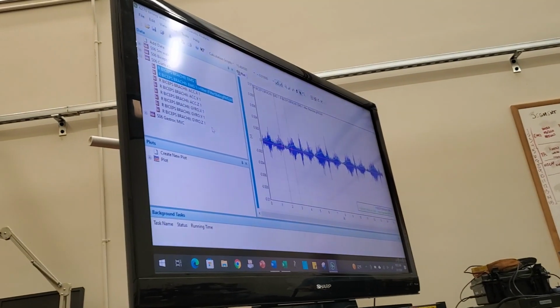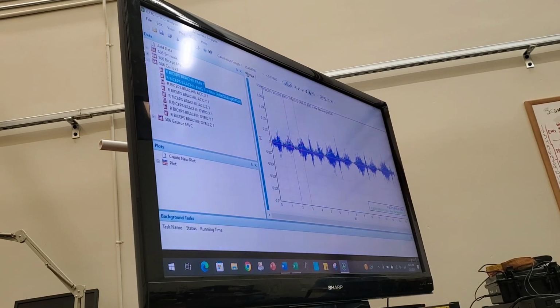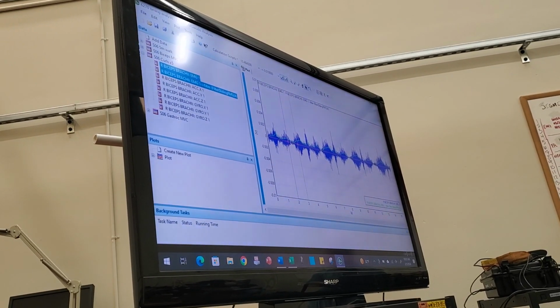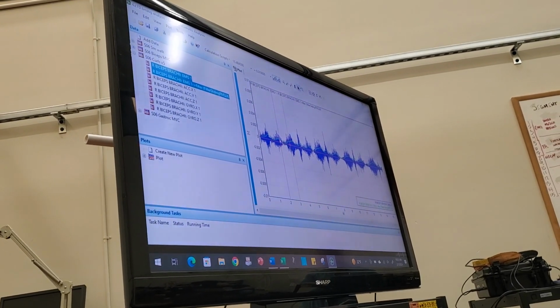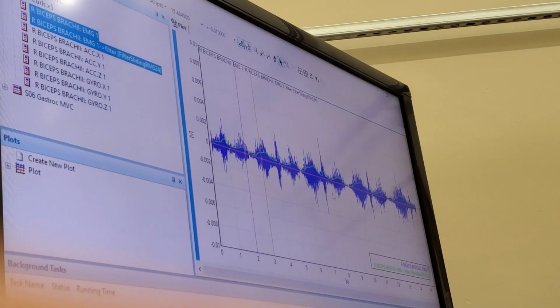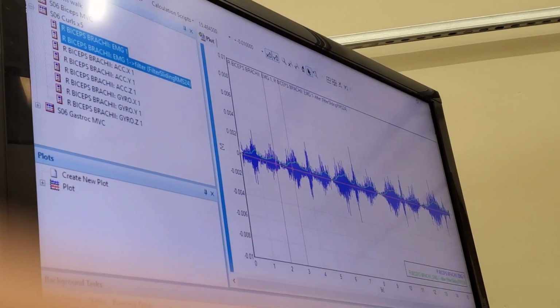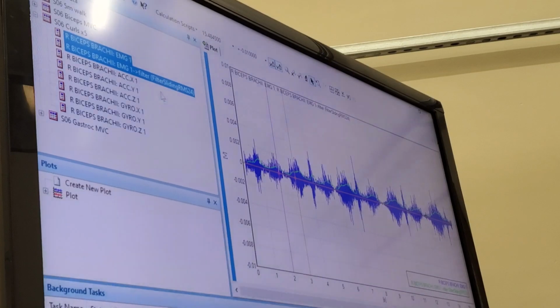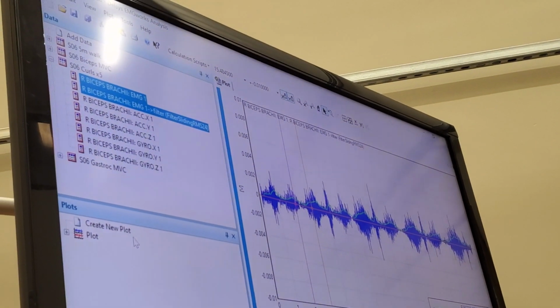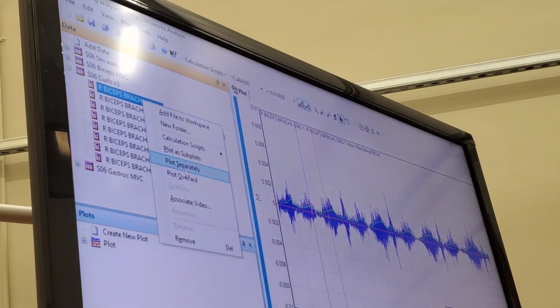I guess I haven't looked at this particular, okay. Alright, yeah, so this will be interesting. So we got 1, 2, 3, 4, 5. Yeah, so this tracing looks pretty choppy. But let's see what we can pull out of that.